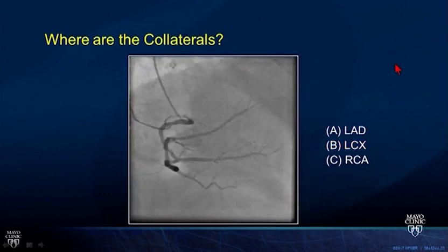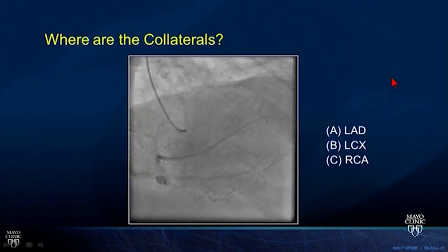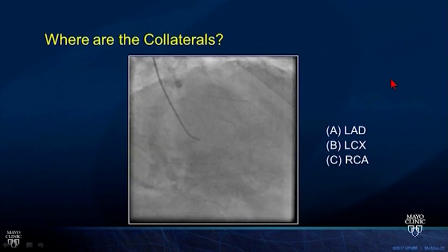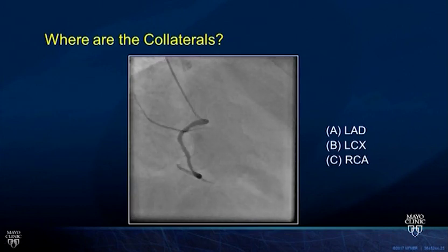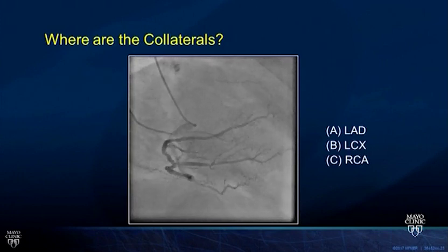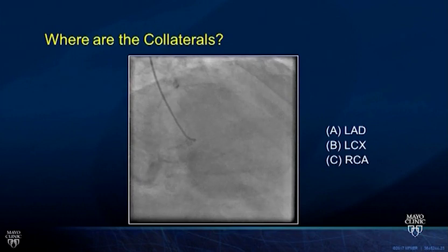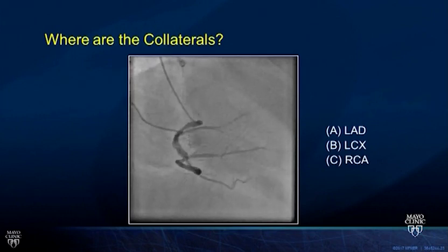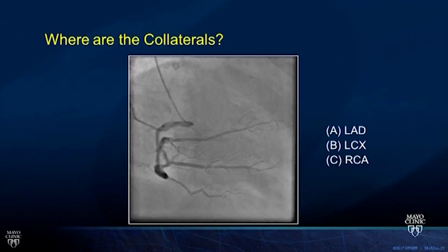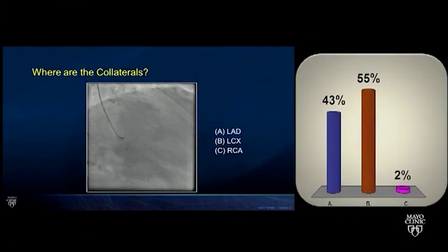Here's a video, and see if you can tell where the collaterals are going here. Yeah, and I think this is a trickier one.